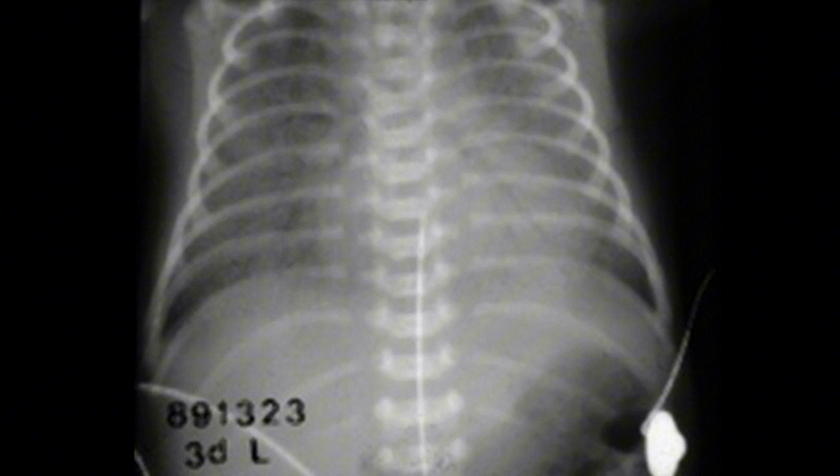They have a characteristic ground glass appearance, which is a term we use to describe a diffuse, hazy, and somewhat homogeneous look across both lung fields. This suggests an issue with the air spaces in the lungs. It's not patchy or localized, which rules out some infectious causes like pneumonia, and the symmetrical involvement really grabs my attention. Further, I notice the presence of air bronchograms.